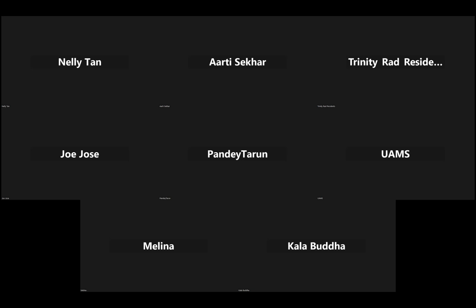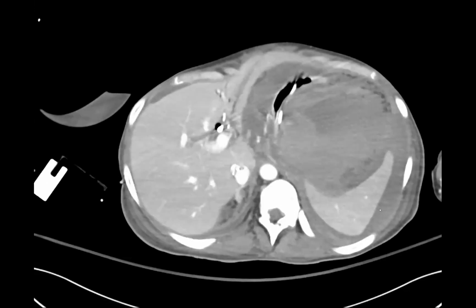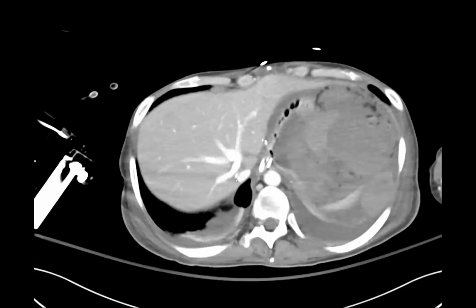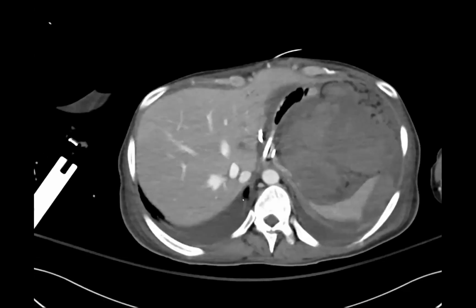Yeah, cool. Okay, I have a case. Hold on, I'm going to pause. Okay. This patient had had a liver transplant. You can see that there are two IVCs here. So this is the piggyback anastomosis of the liver transplant and some surgical clips, which are always a clue that you're dealing with a liver transplant.